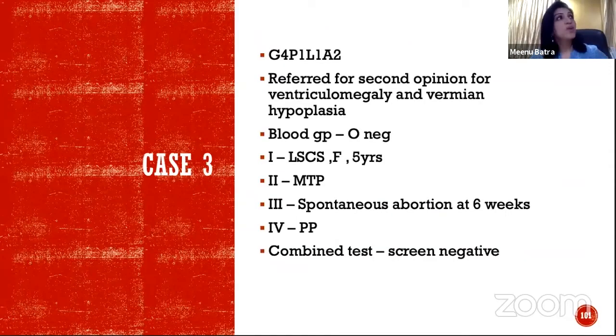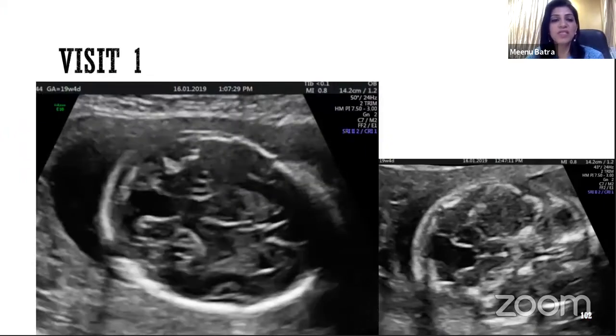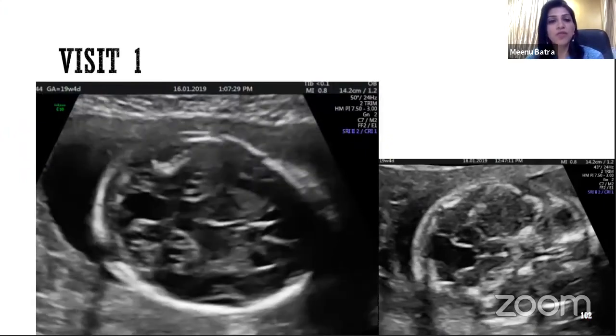Okay, we have a lot of questions popping up and there is shortage of time. So we have 10 minutes more, but I think we'll take this one case quickly where the patient was again referred for a second opinion for ventriculomegaly and vermian hypoplasia. So Mohit sir, can you please describe what we see in this axial imaging of the brain?